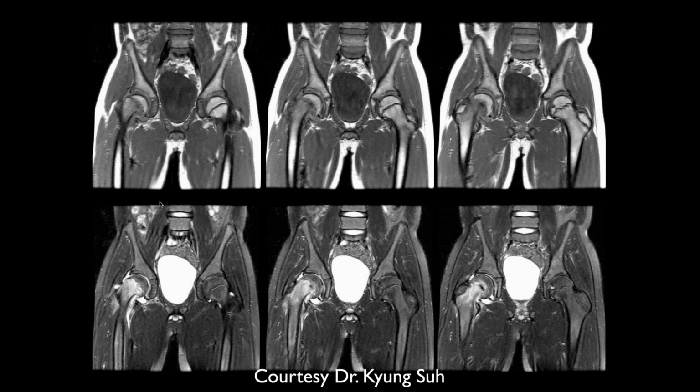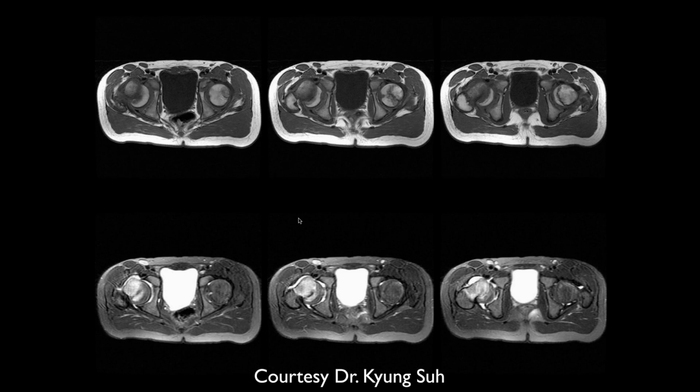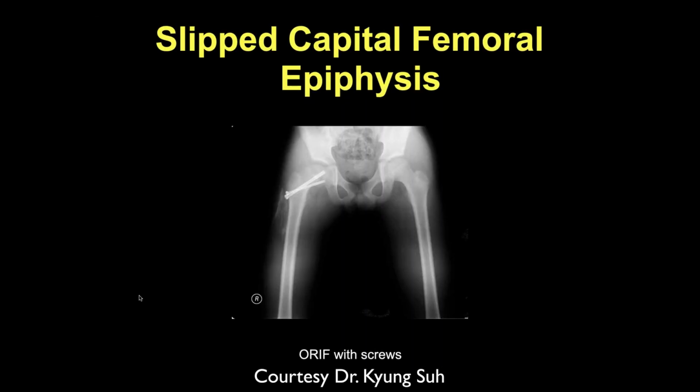Just more images of that. You can see increased edema at the physis and extending into the femoral neck as well. It looks unstable. Right. You can see it's almost completely disassociated. Yeah. Good.